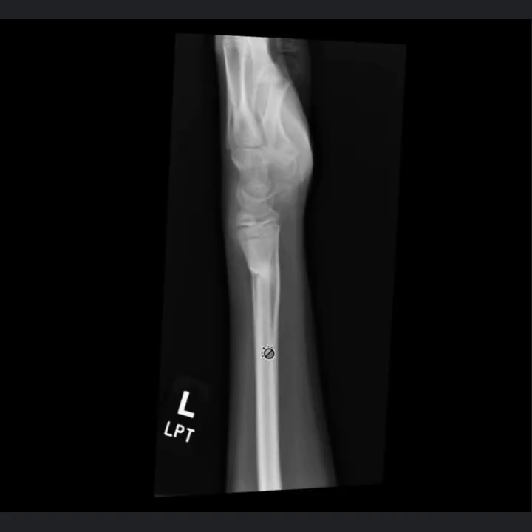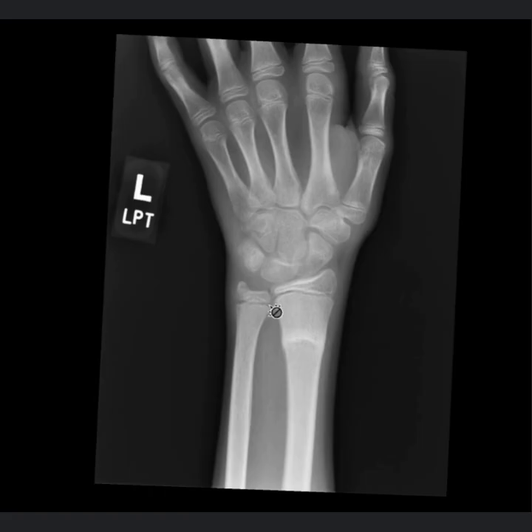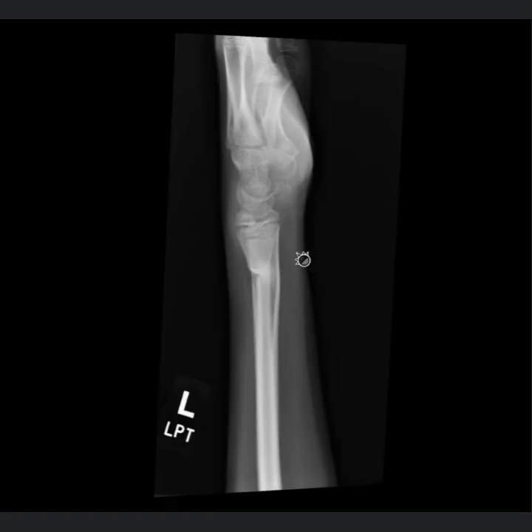And his last x-rays upon discharge are here. And you can see there's good cortical thickening here, excellent fracture healing seen. And you can see that the fracture remained in a stable position on those x-rays. And so he was in that cast for approximately 4 weeks, and then was placed into a Velcro brace for approximately 3 weeks. No contact or sports-related activities for approximately 6 weeks, so as not to fall and have a re-injury to the area.